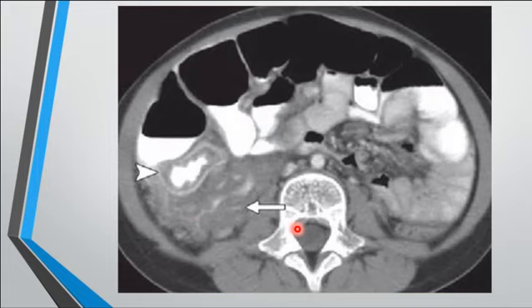Okay, I will help you. It's not an easy case. This is not the terminal ileum. Terminal ileum and sigmoid. This is a mass extra, meaning extra bowel, outside the bowel. Okay, extra intestinal mass that is lobulated here. And this is the cecum with a wall thickening. Do you have any idea what's going on here?